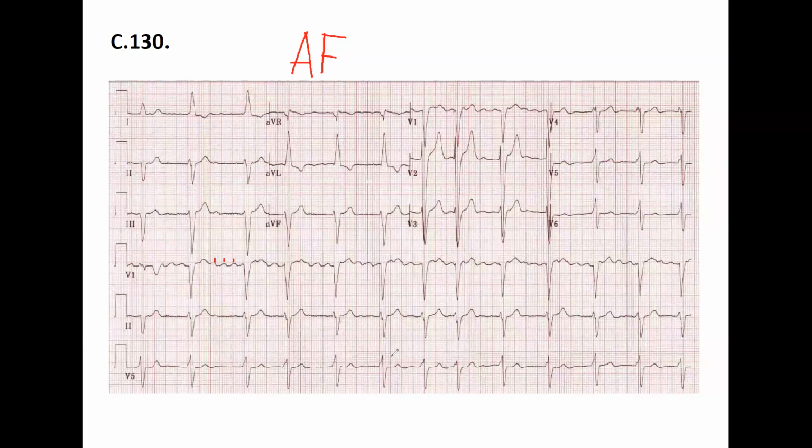Good. Now, you don't need to talk about the P wave or the PR interval. You have to talk about the QRS complex. The QRS complex is wider than normal. So what do you think? Why? I have no idea. Okay, guess. Why can the QRS be wide?